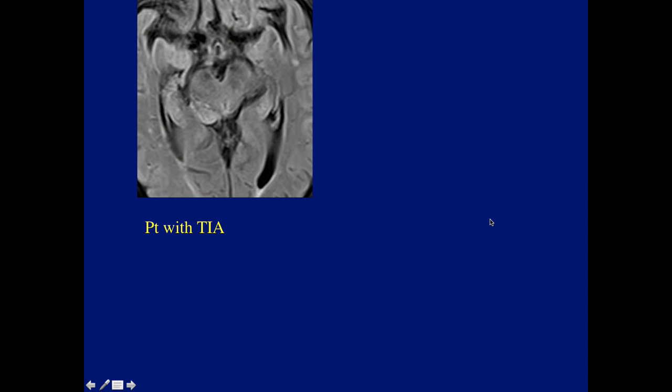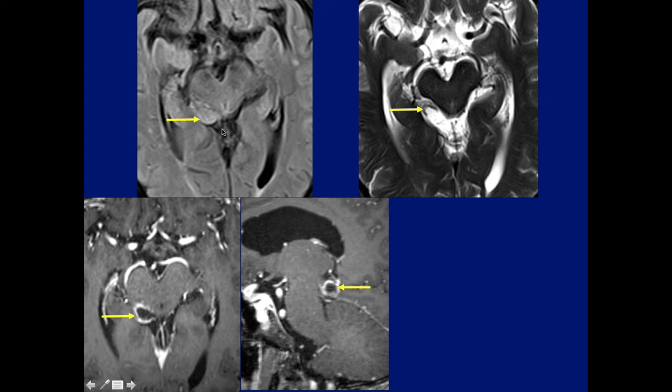This was an interesting case that came in and then after one study disappeared, so there's no history at all if the patient had symptoms or not. So anybody see anything? Right side, as Nate says, there's a lesion on the right side. Here's some more imaging. Any possible diagnosis? You have no diagnosis, just a presumptive diagnosis.